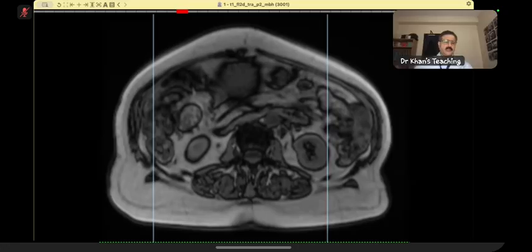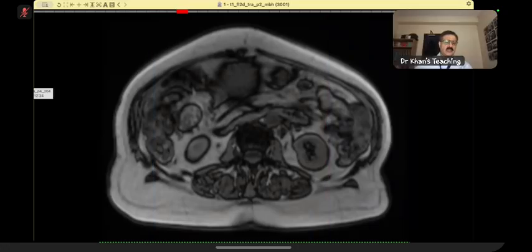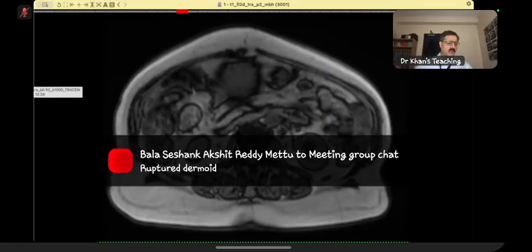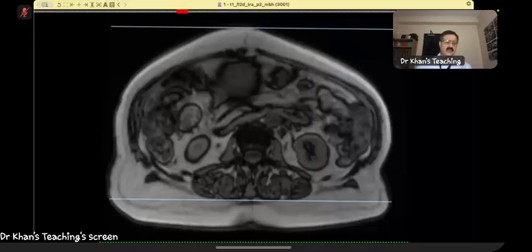Okay, thank you. Now, this case is immature teratoma. The most interesting part of this is that this patient is 78 years old. That is a very, very unusual presentation, so I did not want to go into that. That's why I did not give you the age initially. I did not want to misguide you. Having said that, the candidate did well.